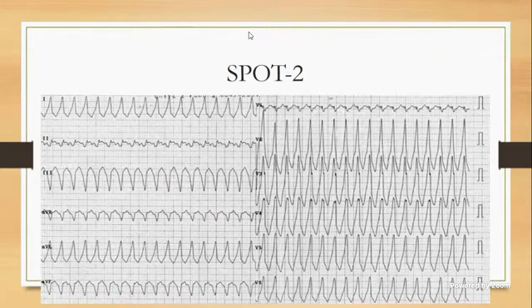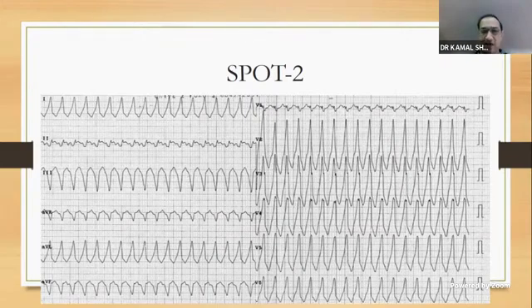Value, sir, you don't know? Come on. No, sir. Anyone? By definition, arrhythmia is irregular only if the longest RR to the shortest RR interval differs by more than, the funny number is 3 in all measurements in ECGs, 3 small squares, which is 120 milliseconds. Okay. The longest RR and the shortest.